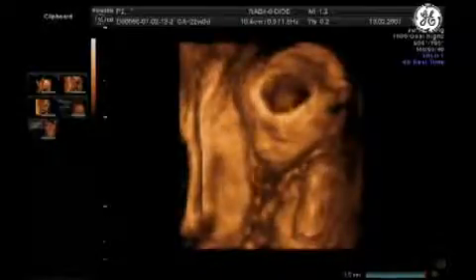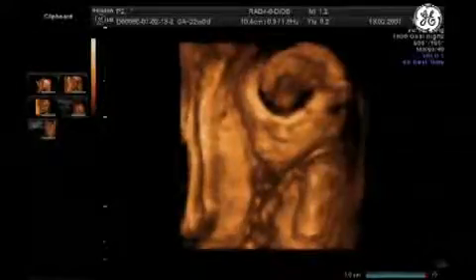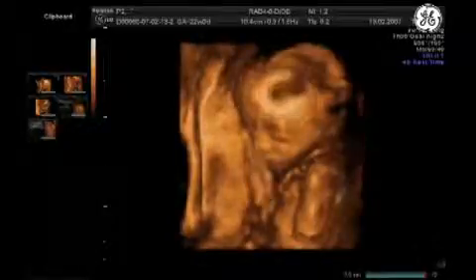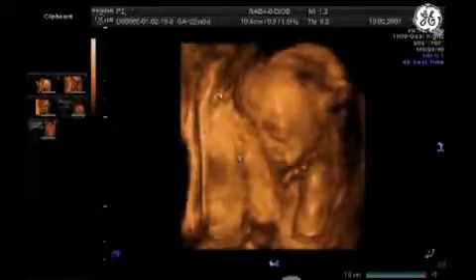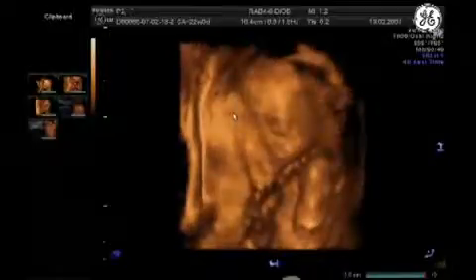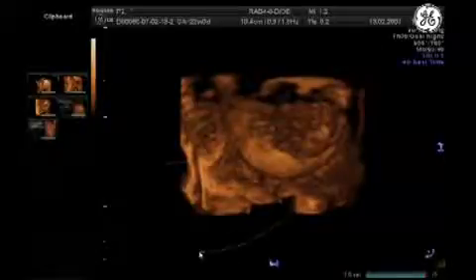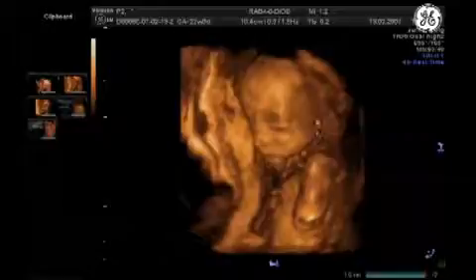Now, with this, I move inside the box, because if I give this picture, it's not really nice because you cut a part of the brain. So I have to go back here. But when I do this, I have something in the front, but I will use a magic cut to remove this part. And I just have to cut this. And also I will cut this part.